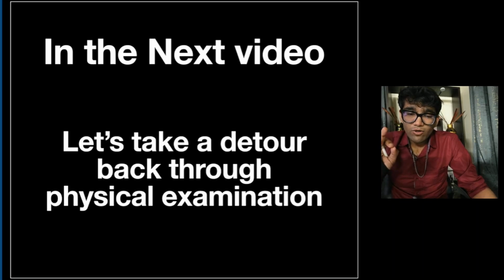From your point of view, what is causing the diastolic dysfunction is very important, because there may be a few differentials, and one of them, a restrictive myocardial ventricular pathology, would be a clear explanation for your patient's shortness of breath.